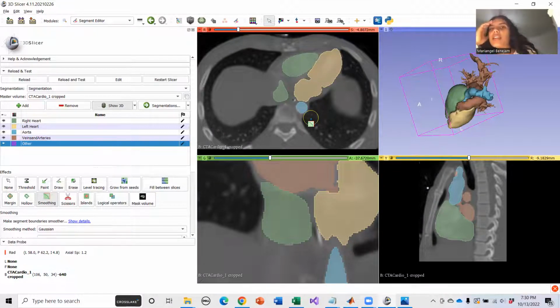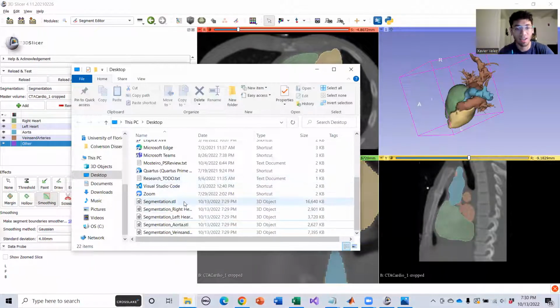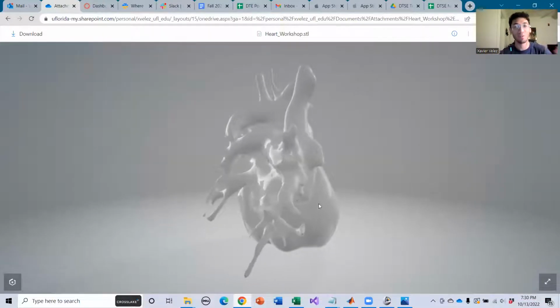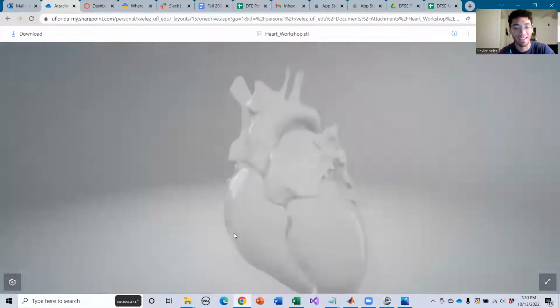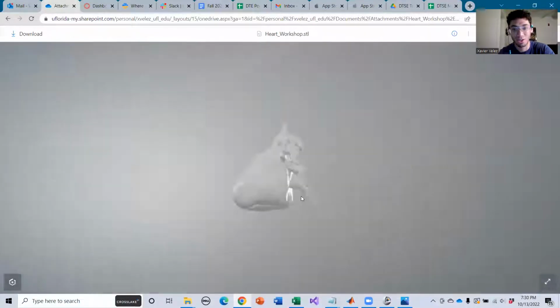I had a quick question. Is that 3D viewer or the segmenter viewer another thing you downloaded, or is it already on your computer? On Windows, I think it's just the Windows 3D object viewer. If you want something else to view it, there are a bunch of options online. This might be a little dumb, but I love the way Microsoft shows their 3D printed files.